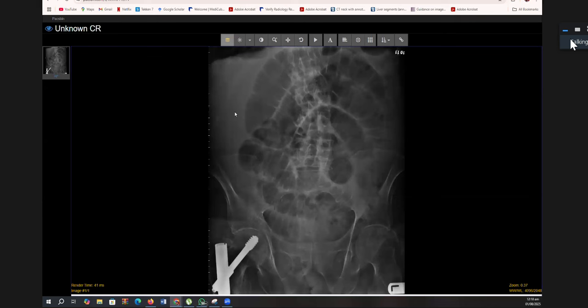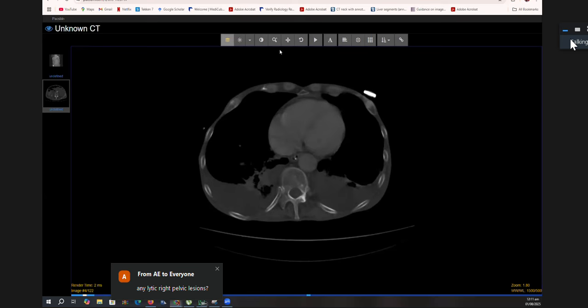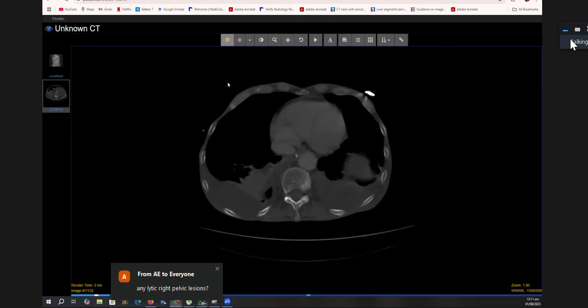So I will urgently pick up the phone and call the on-call surgical unit and advise a CT scan for the patient. So we'll do the CT scan and I'll show it to you. Just go straight into the axial images. Don't worry about the scout. Again, the examiner might help you by saying, ignore this image, this image, this image, just go for that image. They're trying to help you, they're not trying to hinder you.